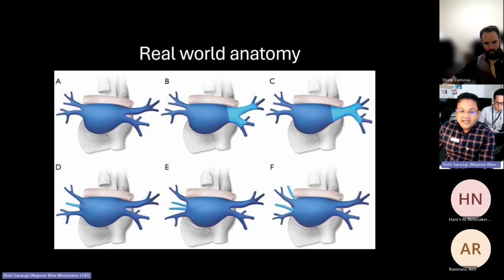As you can see, there is a right middle pulmonary vein, which would be draining the right middle lobe of the lungs. Similarly, there are 2 here and 3 here. Now, these things are very important. This anatomy is very important for people who do EP studies or are going to do imaging for pulmonary vein isolation. Having said that, I'm not an expert in imaging for EP studies, but they also look into CT anatomy and MR anatomy along with the TE anatomy.